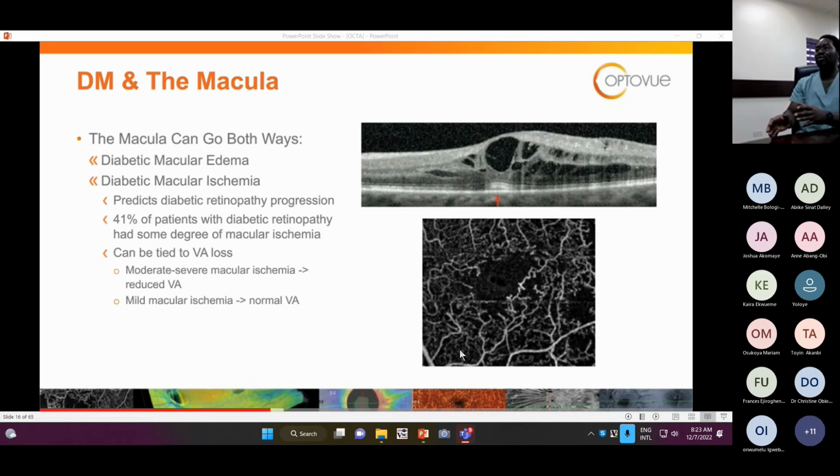Now, a lot is going on in the macula. If you are looking at cross-sectional images of only OCT, you get a lot of information on edema, swelling. That is how much swelling, how much fluid do we have in the macula. We can see the cystic hyporeflective lesions within the inner retina, and we can see the thickness of the retina on OCT maps. The OCT angiography helps us to further classify and to further view the details of the fovea. It helps us to assess the fovea avascular zone and the vascular density in the area of the fovea, as we've not been able to do before.